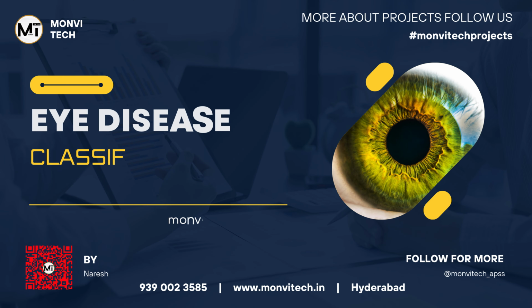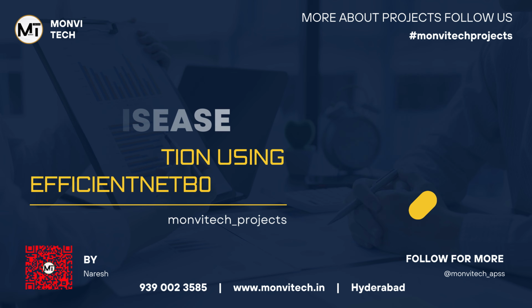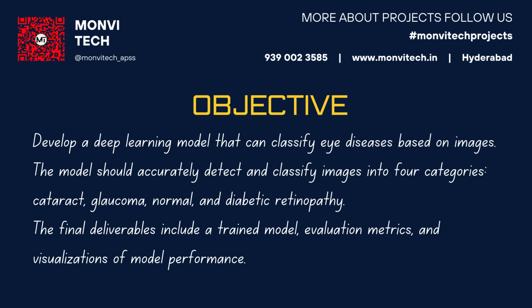Eye disease classification using EfficientNetB0 project. Objective: develop a deep learning model that can classify eye diseases based on images. The model should accurately detect and classify images into 4 categories: cataract, glaucoma, normal, and diabetic retinopathy. The final deliverables include a trained model, evaluation metrics, and visualizations of model performance.